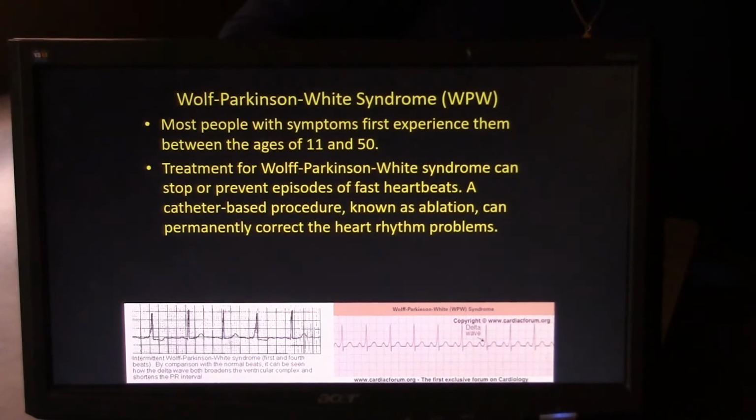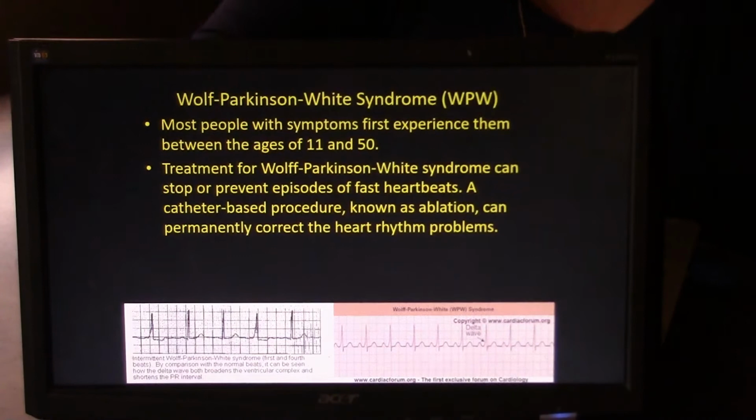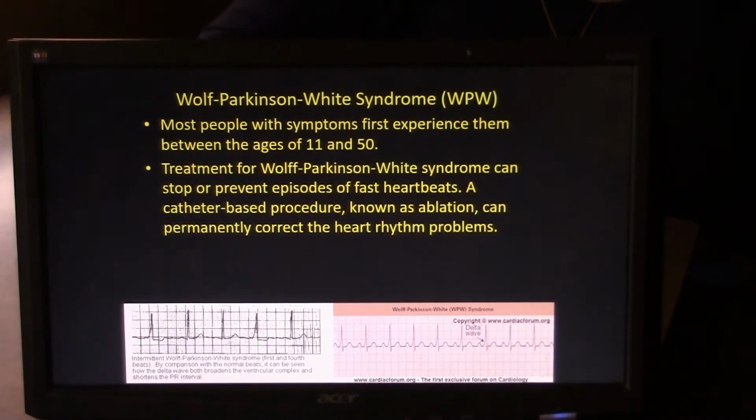Always remember that treatment depends upon the patient's clinical signs and symptoms and level of stability. Another thing that's important to remember is to always check your patient first. Don't just go by the EKG rhythm. There may be a lead disconnected, or the patient may be brushing his teeth, and it'll look like ventricular tachycardia when there's actually nothing wrong. So always check your patient first.